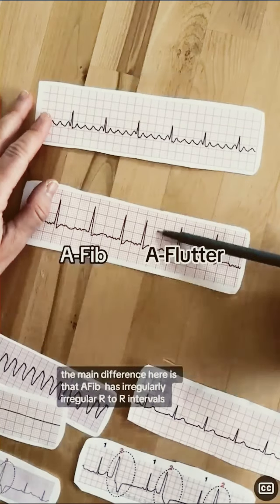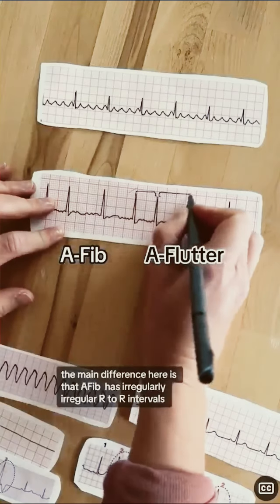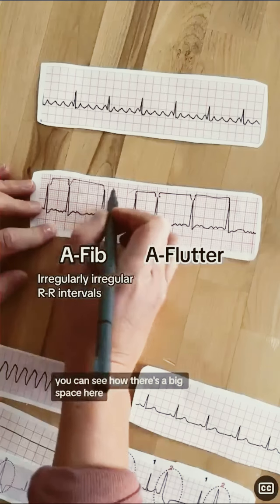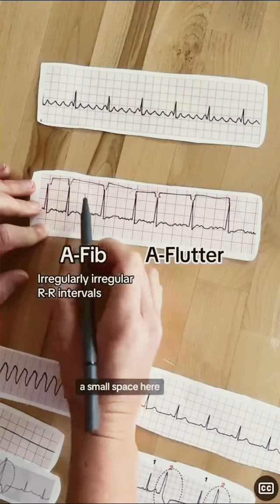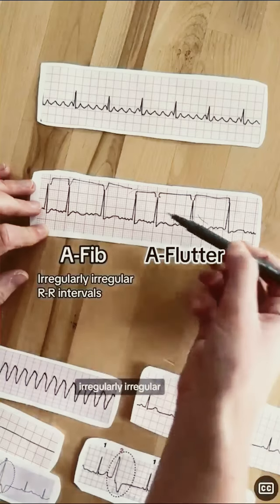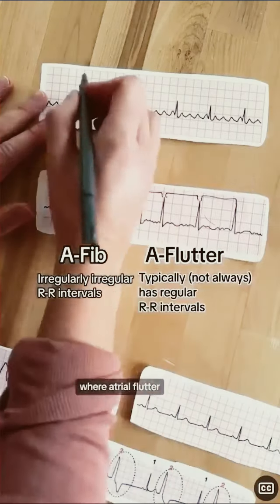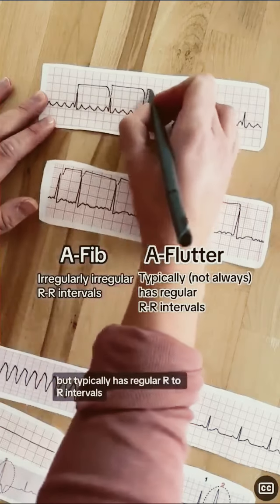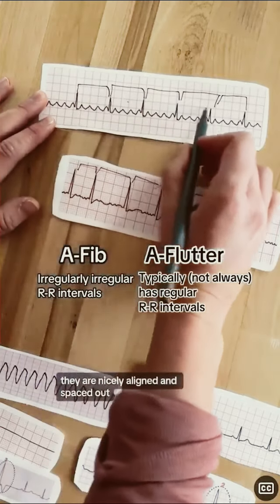The main difference here is that AFib has irregularly irregular R-to-R intervals. You can see how there's a big space here, a small space here, a small space here, and a big space. They're irregularly irregular. Whereas atrial flutter typically, not always, but typically has regular R-to-R intervals. They are nicely aligned and spaced out.